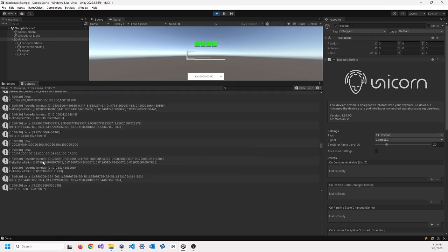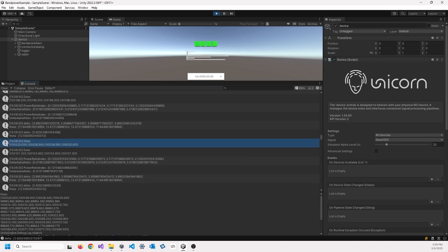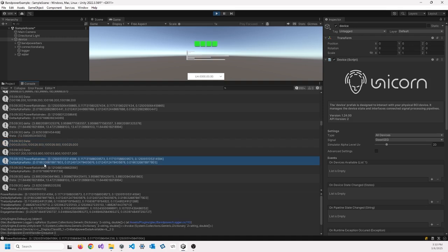There are a couple of different events that I'd like to show you. There's the on ratios available event.